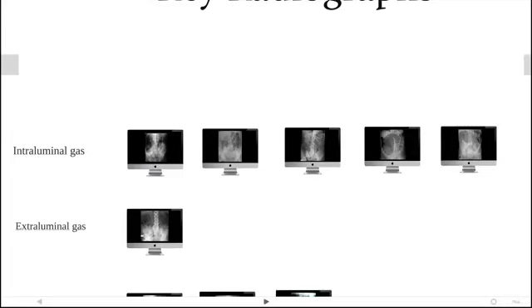In truth, bowel itself is most clearly visualized when there is some pathological change. As we saw from the normal film, all of the bowel is not clearly discernible when the film is normal, but as we shall come on to see, when there is a change of pathology, both small and large bowel are more easily distinguished.